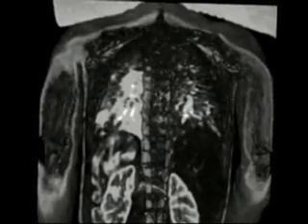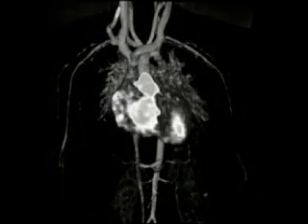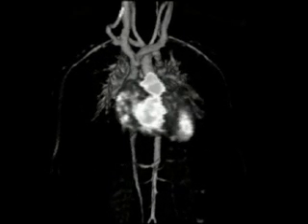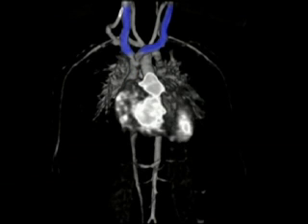Magnetic resonance imaging, in short MRI, is an imaging modality capable of producing three-dimensional morphological information. Contrast-enhanced angiography data, as is shown here volume rendered, can be used to determine the cause and origin of vessels external to the heart. Clearly visible in the dataset is the vena cava superior and connected veins.